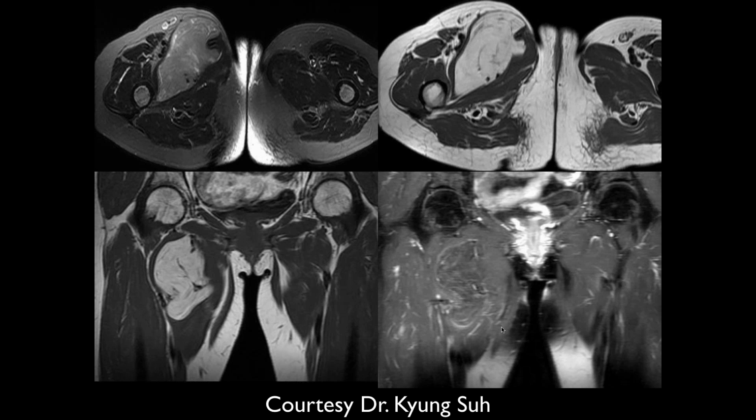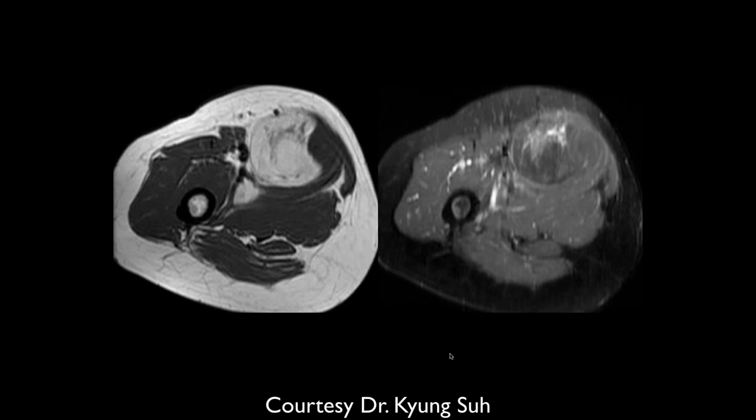Okay. Where do you think there's enhancement? I see some vascular structures going through it, but I don't think it enhances much. It's maybe a little bit peripheral, but no nodular or central enhancement. I thought you said it did enhance a lot. It did not. Okay, fine. And on this lower image, we see some central fat signal.